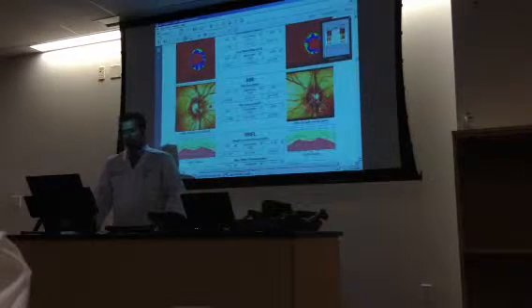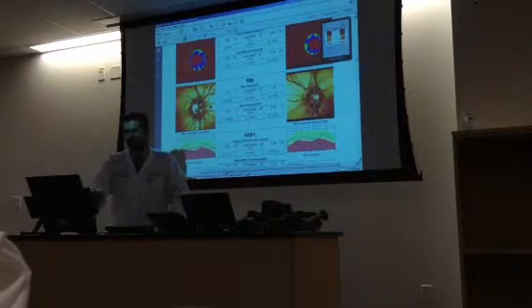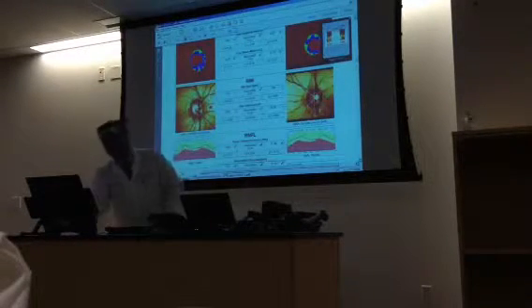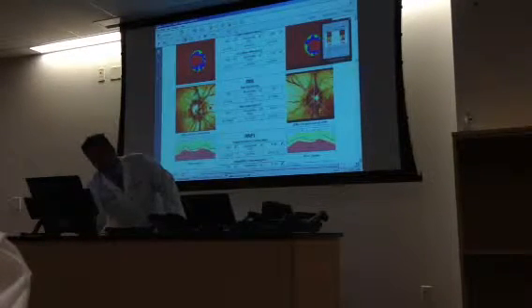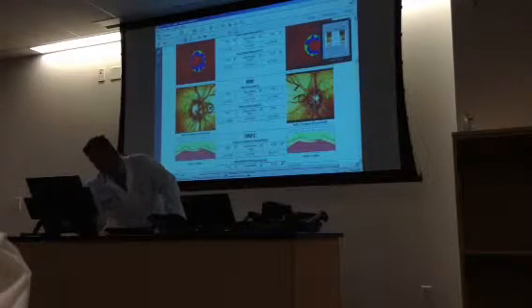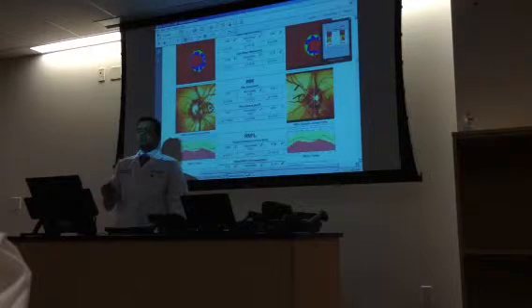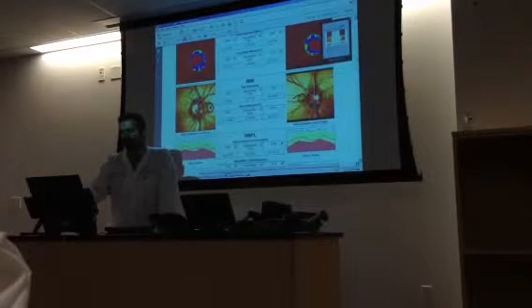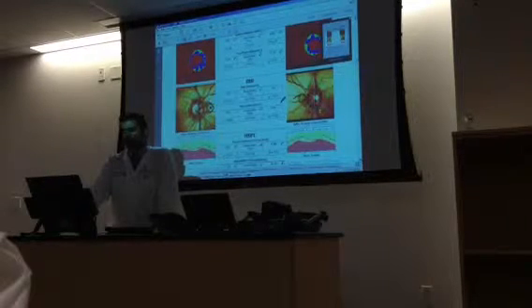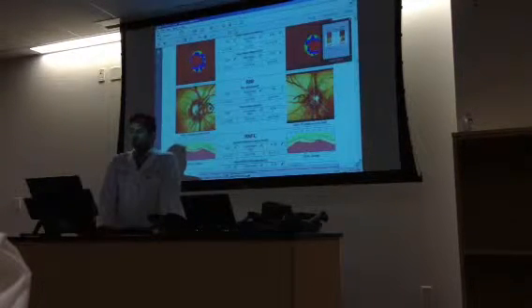Then you go down right here, you see it's divided into sectors, and each sector has a check mark or an X or an exclamation point, essentially telling you if that sector is within normal limits, there's a green check mark. If it's borderline, there's an exclamation point, and if there's an X, it is outside normal limits.